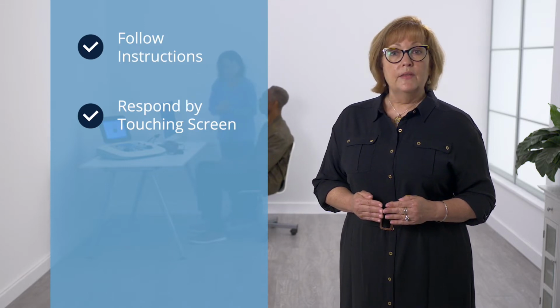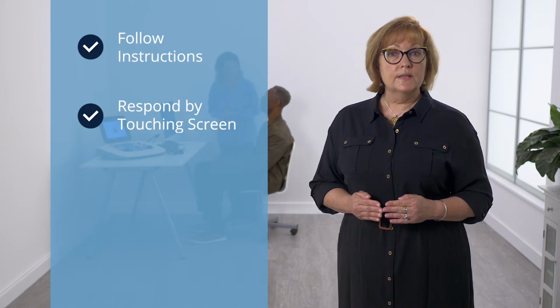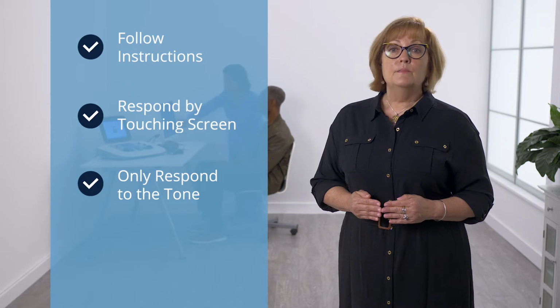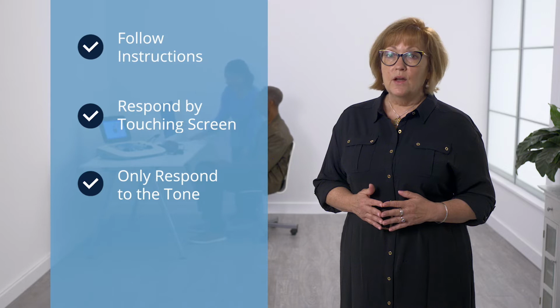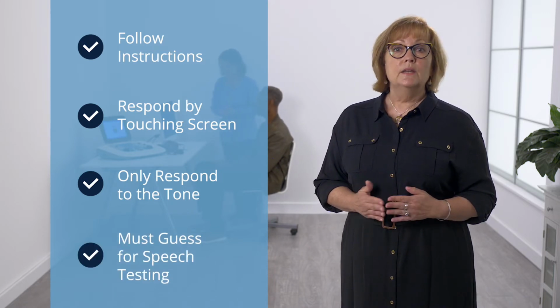Inform the patient that during the pure tone test, they may hear a swishing noise as well as a tone. They should only respond to the tone. Be sure to stress that during speech testing, some of the words will be very soft and they must guess by simply selecting any word on the screen to proceed through the test.